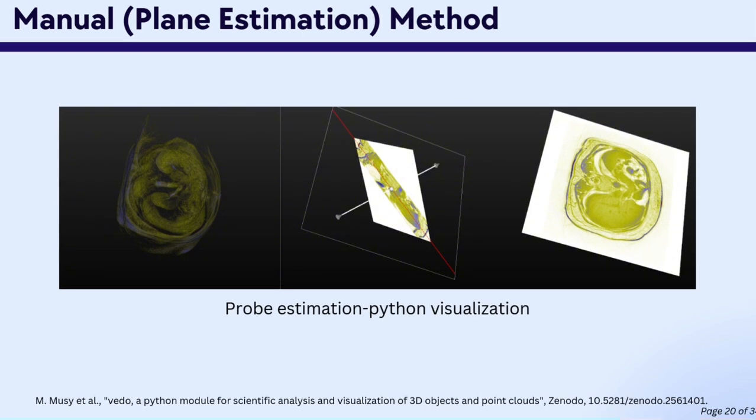After the initial registration, we simplify the process for subsequent frames. During surgery, the probe movement is minimal. We consider 8 nearby CT planes, adjusting for rotations and translation relative to the previously registered frame. Using LightGlue, we detect and match key points across these planes, determining the best match using the target registration error.